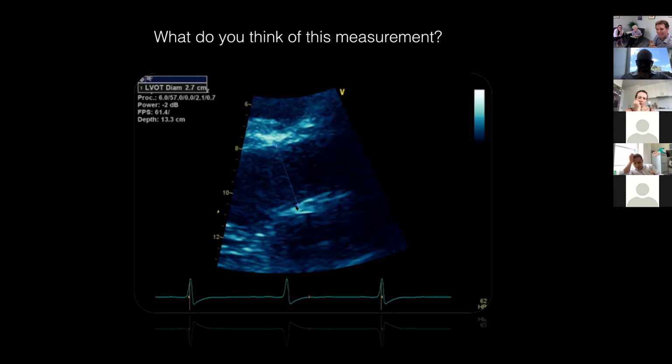So again, if I made this measurement, the next thing I want to go is like, wow, that is massive. This guy better be 6'8" and 125 kilograms and a basketball player, or I've made an error, right? So that'd be the next thing I want to go and do. That's a weird value. Go and check it out. And be very, very cautious if I'm doing my continuity equation that I don't overestimate the size of the valve.